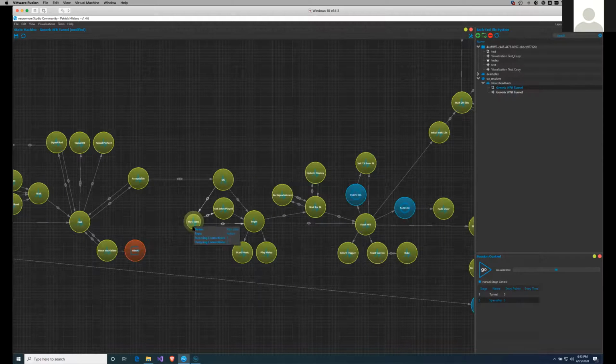And then we play an intro. The intention of the intro here really is to educate the user. It's mostly aimed at people who do the session for the first time. So let's consider you want to create a simple, consumer-friendly, push-button easy application. People just press the play button. We made sure that the signal quality is okay. If not, we gave them some advice to hopefully fix it. Now we got to a place where it's set up correctly, and we play an intro to tell people what's about to happen, what the whole experience is about, and so on. People are also able to skip that particular intro.